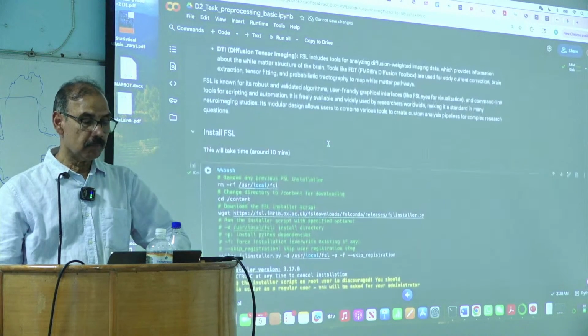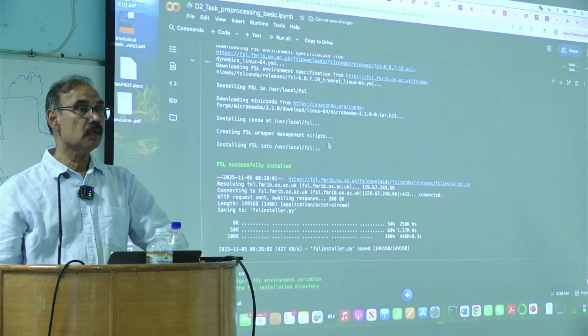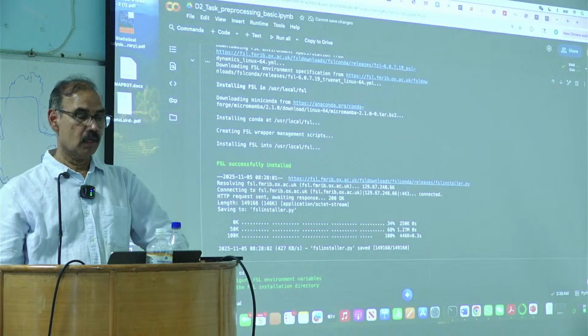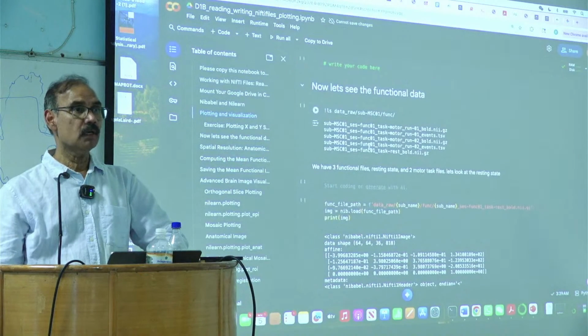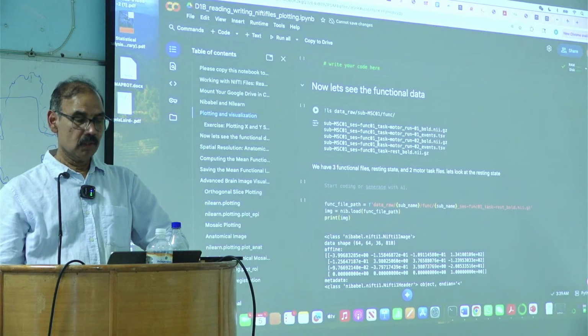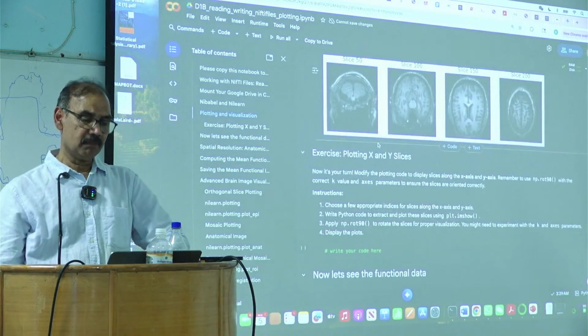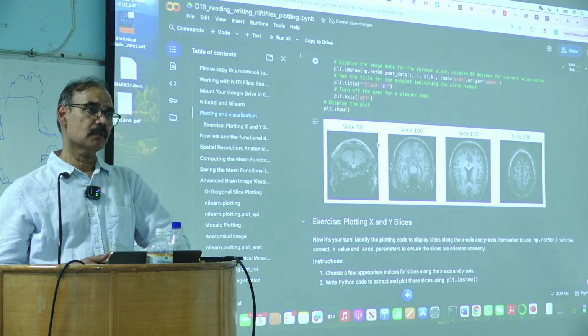It is the way it's displayed, but you can change it for other values.